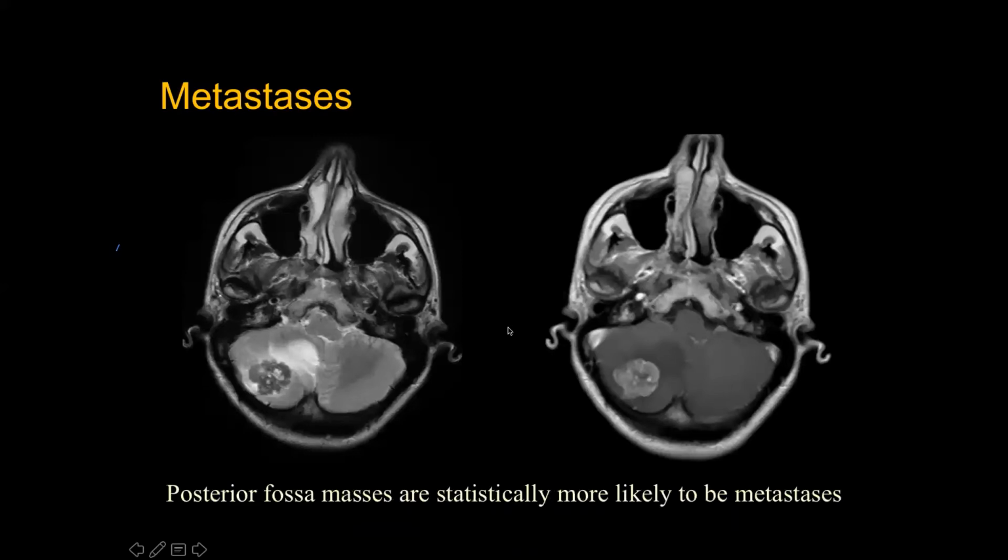And in the posterior fossa, if you see a primary intraaxial lesion in an adult patient, statistically, this is going to be a metastasis. And in this particular case, this lesion has quite a typical appearance of a mucinous adenocarcinoma metastasis: lobulated, black, almost like cauliflower, and they enhance poorly. On T1, they can be almost isointense to brain, and on CT, they tend to be bright, tend to be dense. In fact, every time you see one of these metastases, someone will call it a hemorrhagic metastasis or a primary ICH, but actually they're just hyperdense lesions.